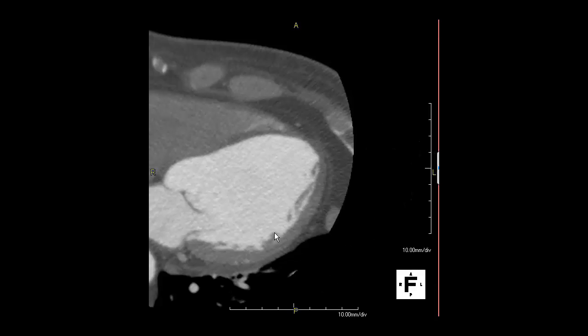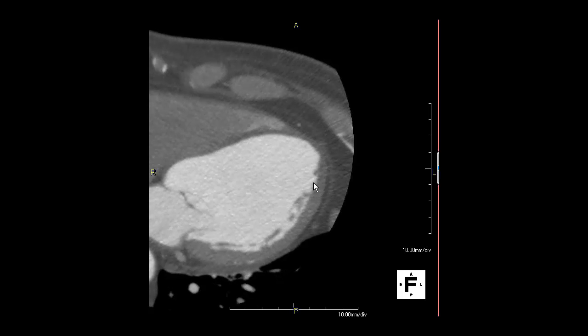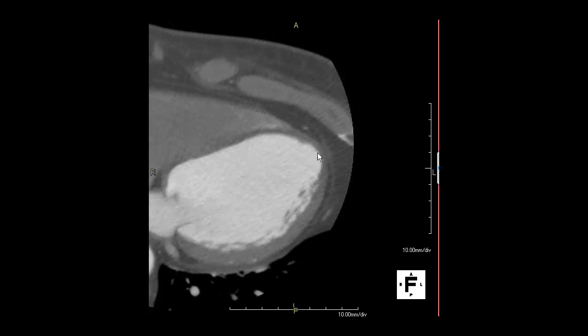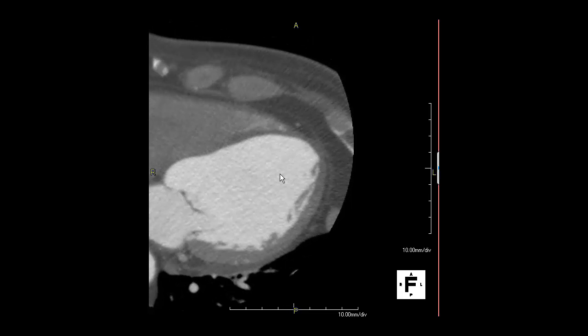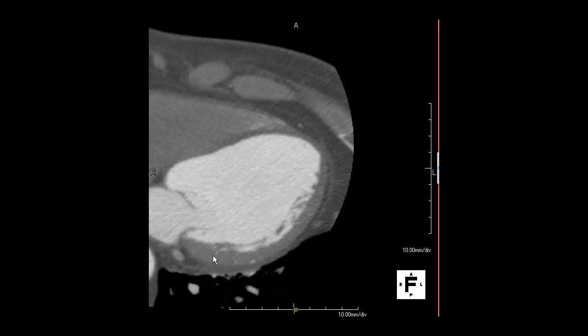Because there was some akinesis, possibly dyskinesis involving the apex, we want to get a better look at the apex. This is a thin section view of the apex, relatively scalloped outward in a normal fashion. And inspecting the area of the apex, there's nothing to confirm the presence of an apical thrombus.